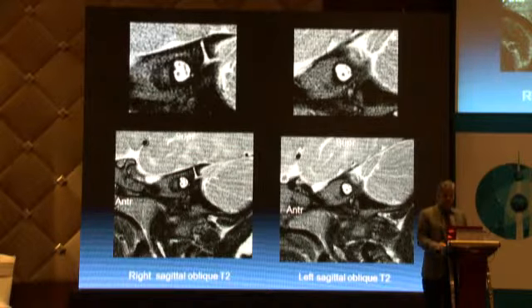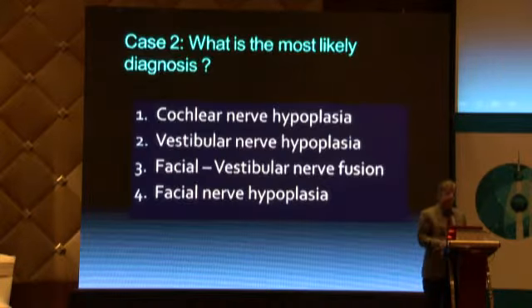Look at it carefully. What do you see on the right side? And what do you see or not see on the left side? And then give the most likely diagnosis. Do you want to look at those images again? Okay, let's go back. This is the right side.